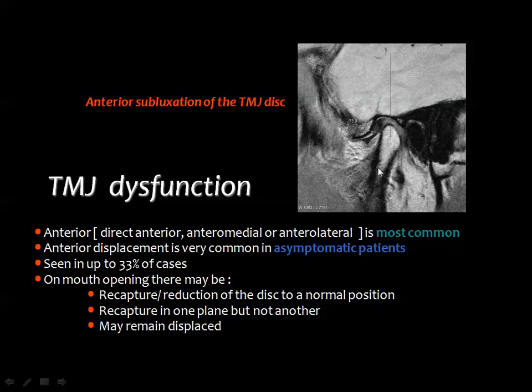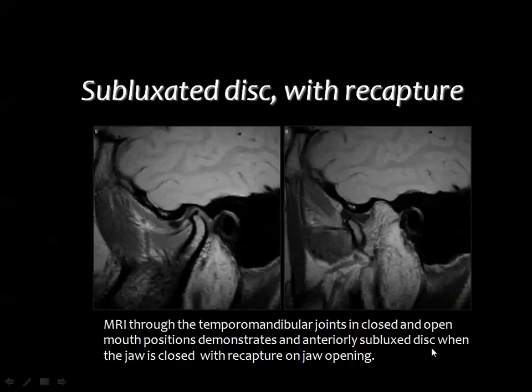After mouth opening, there may be recapture or reduction of the disc to its normal position, or recapture in one plane but not in the other, or may remain displaced, as I will show to you.